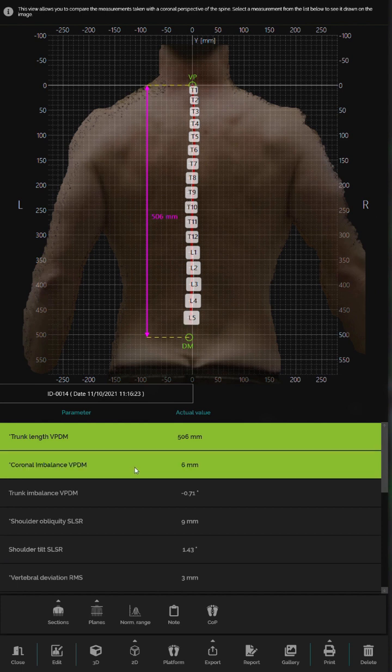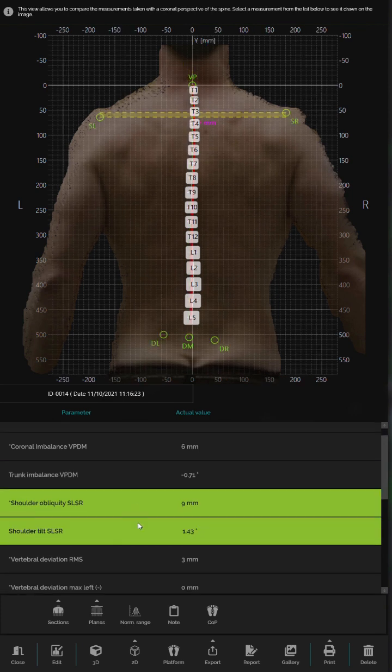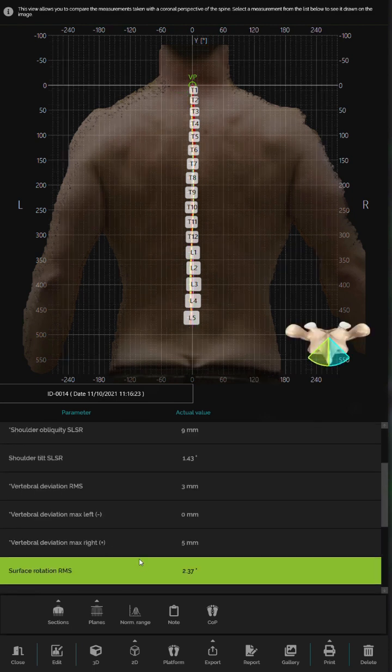Sometimes you can see a rotation or a distortion. The patient can't always see that, so we can add and subtract the standardized data, which is a visual representation of the numbers. And this one is particularly showing rotation.